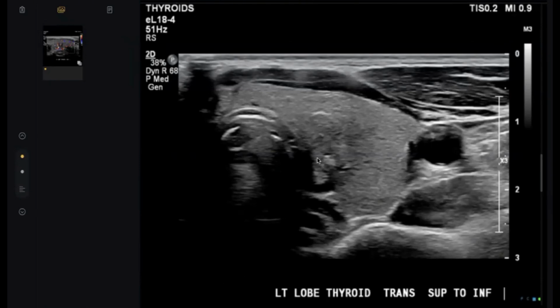Next is the lymph node. What are the malignant criteria? Number one, loss of the normal kidney or oblong shape. So it becomes globular with absence of the fatty hilum and a thick cortex. Lymph nodes may contain calcification.